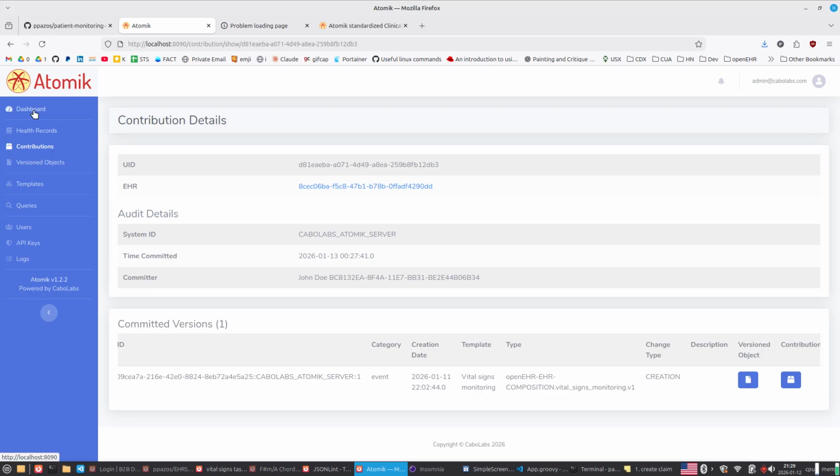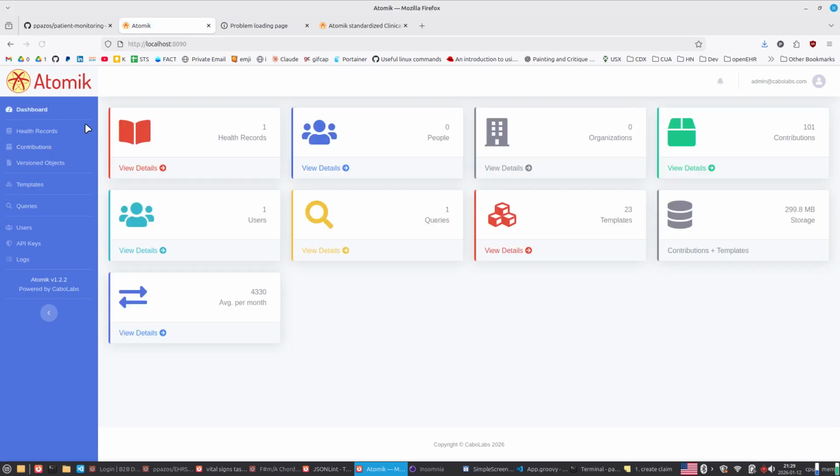One thing you might see here is that the loading process also created a query. So this data query is what we will use to get the data visualized in our dashboard.